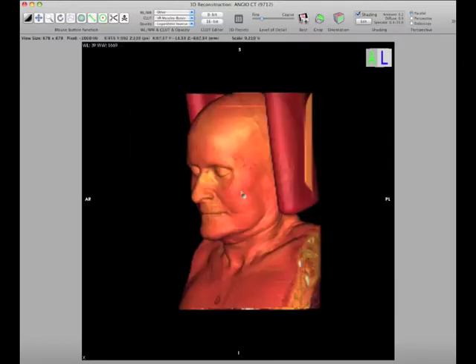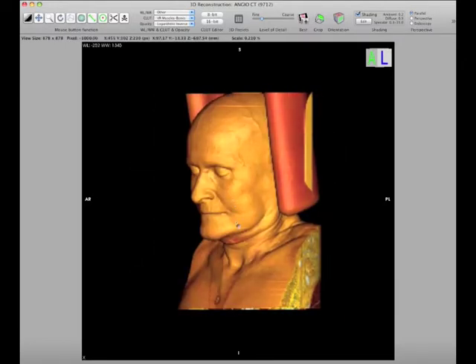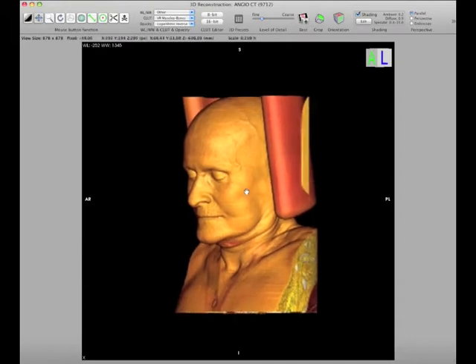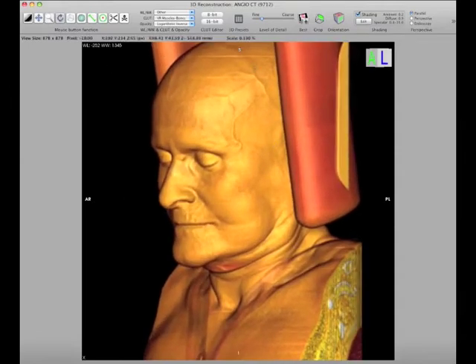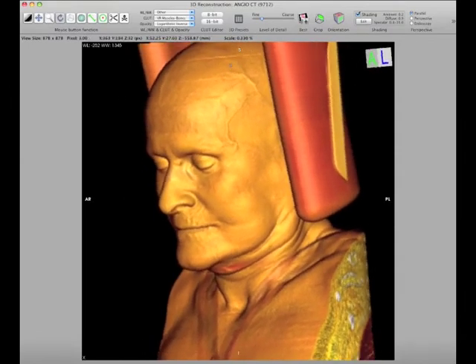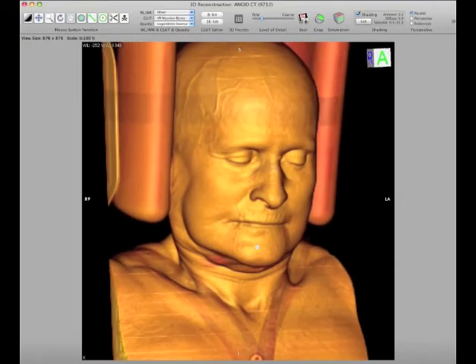And we're going to start off with, just like we had tools in the upper left of the first window, we have tools here as well. Window leveling tool, which adjusts grayscale values and applies color lookup tables to them. And the trick to this is clicking and dragging up, down, left, and right. Moving, you can obviously move it, zoom it, rotate it around the camera this way, or rotate it in 3D space like this. Okay?